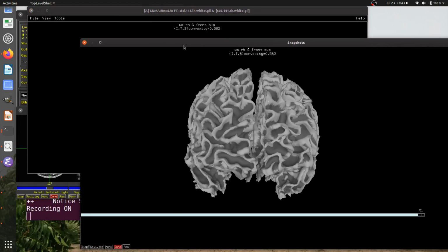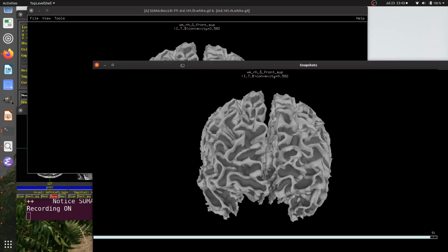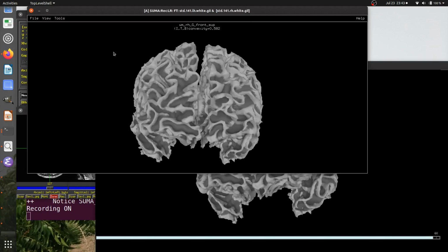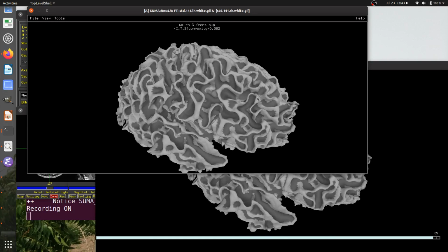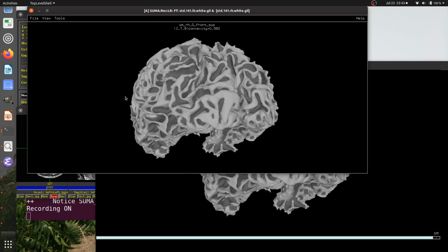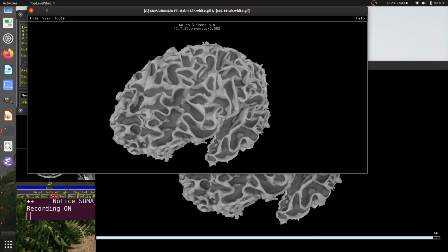This thing here is actually just an avatar, and it works a little similar to the AFNI recorder. If you watch this number here as I do something, you'll see the brain rotate. This is just following me, and this number is getting bigger.